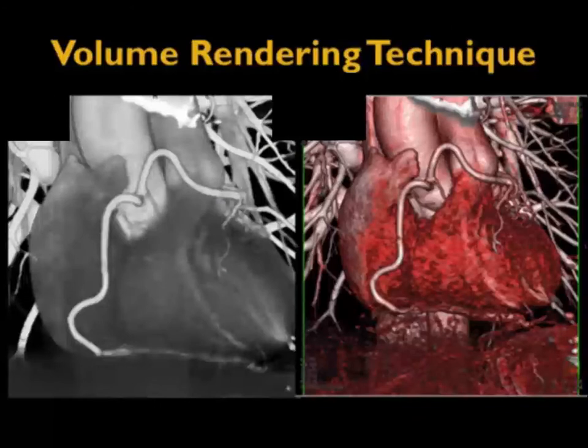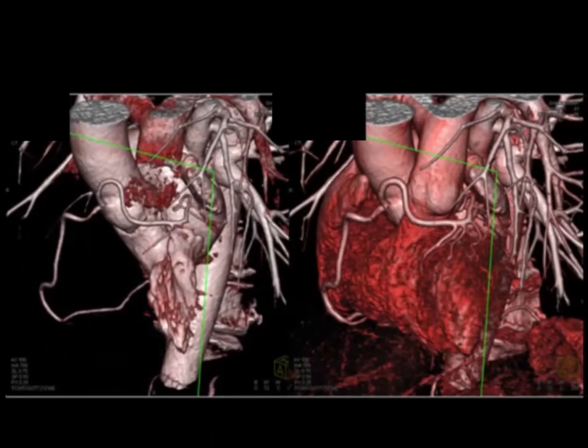And you can see the 3D mapping. Again, color coding works very nicely. A really good look at the vessel map. You can see, again, the common trunk to a single vessel. Very, very good showing on that.